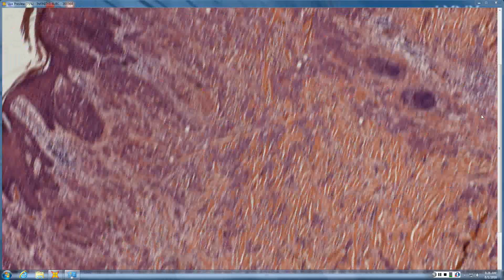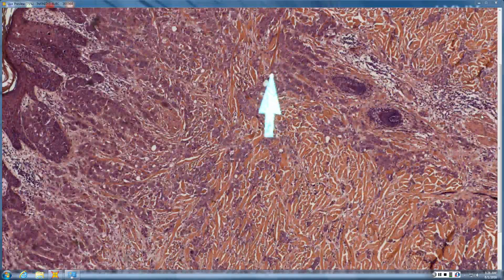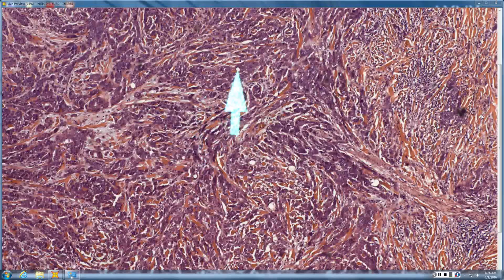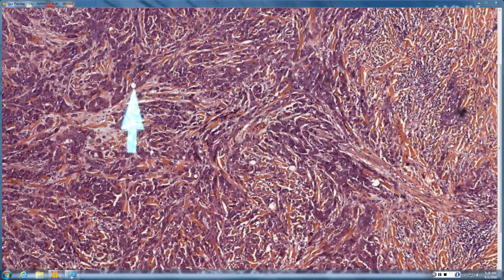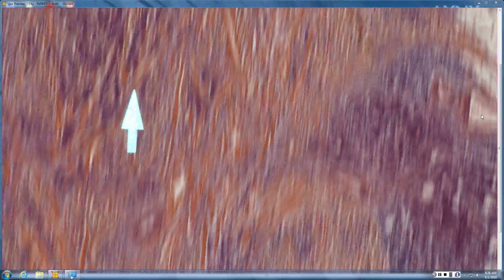You have lots of little clear circles in the carcinoma. So you might get a form of Paget's, or Paget's with an infiltrative adenocarcinoma underneath. You can get a mucicarmine to see if it's really adeno-differentiation underneath.